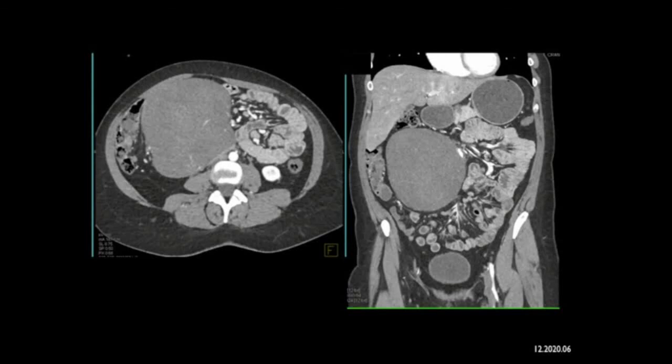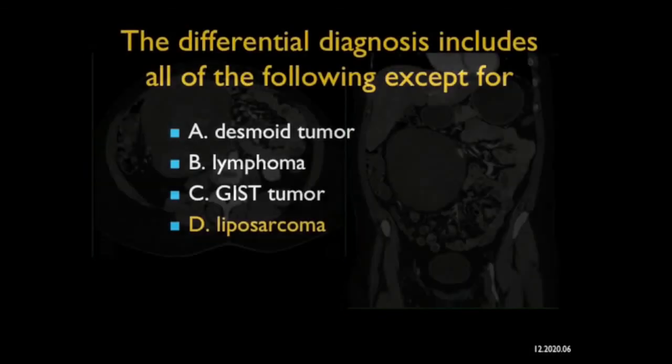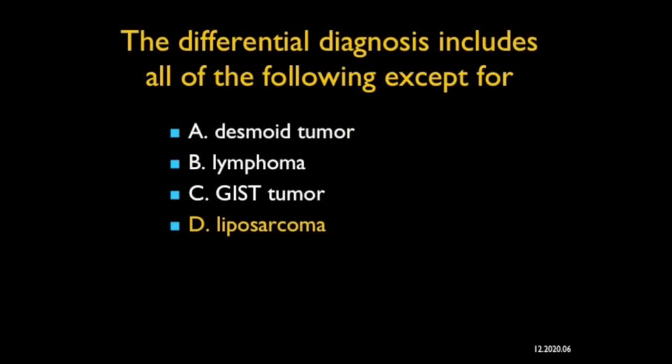What this is not is a liposarcoma. Yes, you'll say some liposarcomas have minimal fat or no fat. This has no fat. Liposarcomas are less well-defined and more infiltrating. This was a desmoid tumor, but the least likely diagnosis is a liposarcoma.